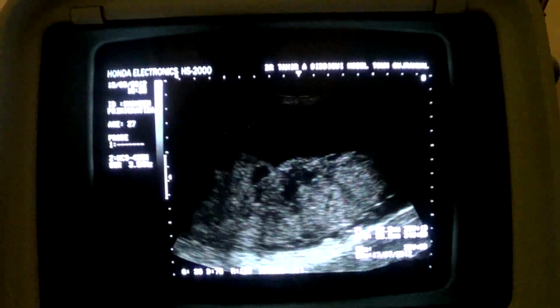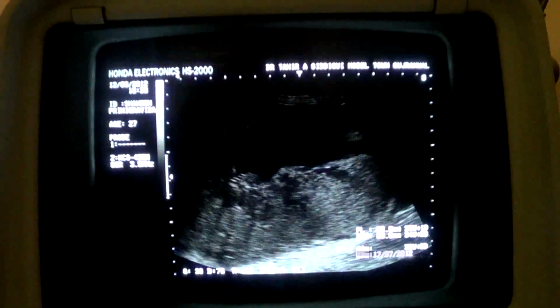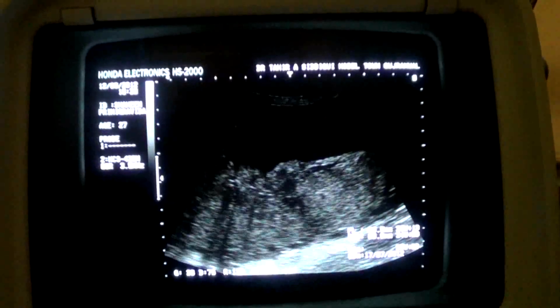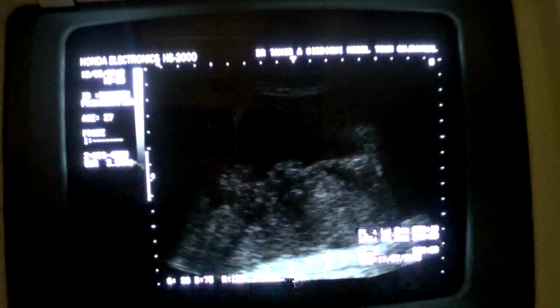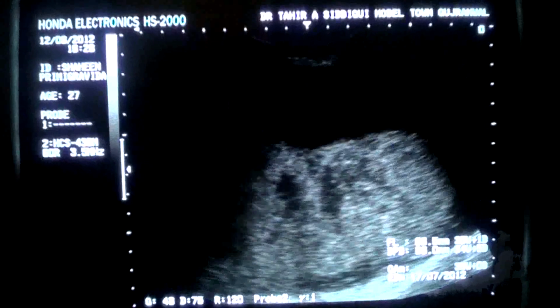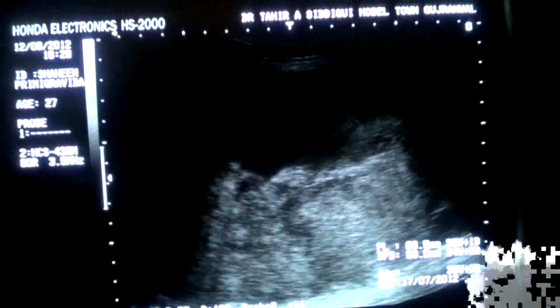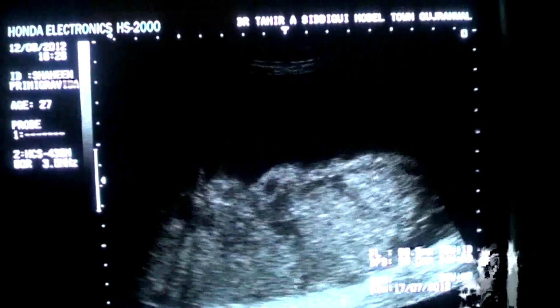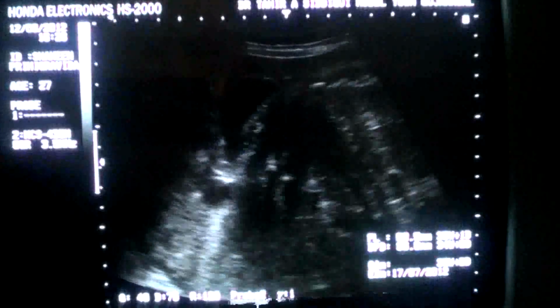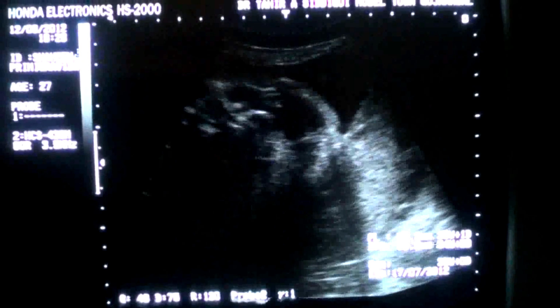Grade 3 placenta will appear as you are seeing in your picture now. Though basal densities are not that prominent, this is how a grade 3 placenta appears on ultrasound. And see, note the clear fluid anterior to the placenta.